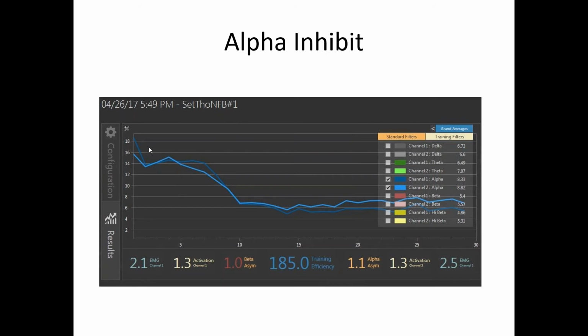component band, and one of the concepts, besides compression, convergence, and layering, is another pattern. You can see here that the blue is on the left and it's higher than on the right, and that shouldn't be. And as these lines converge, they also compress. And one of the key concepts there is that whatever you do on one side affects the other side, but also whatever you do in one area affects the whole brain. You're inadvertently training the rest of the brain to some degree.